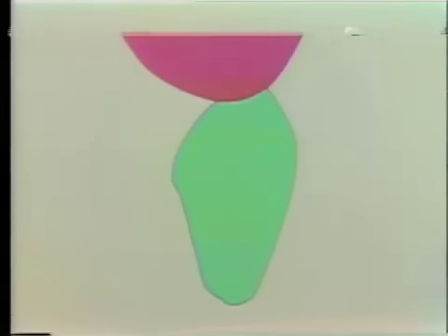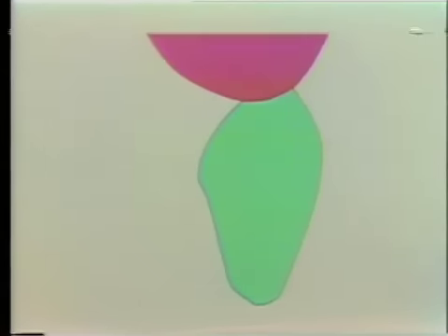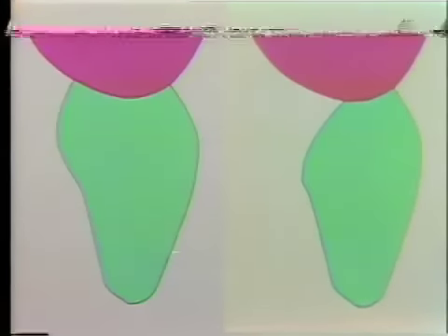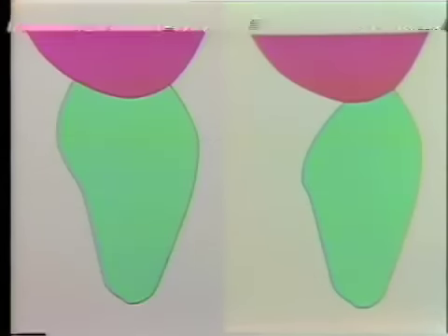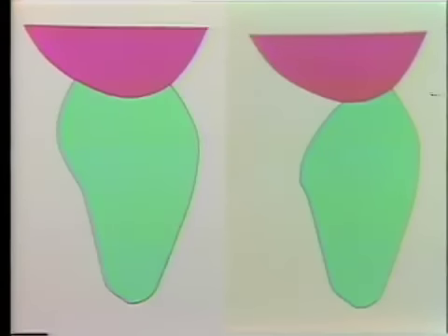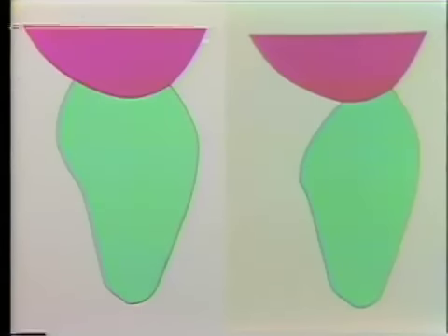There is another type of Pontic which is used in the anterior situations and sometimes in the posterior, described as the saddle Pontic. I think you can see how the name is derived from the relationship of that Pontic to the alveolar ridge. It sits across it, much in the way that a saddle does on a horse's back. The area of mucosa which is covered is considerably greater, nor is it so easily cleansed under there as is the ridge lap type of Pontic.